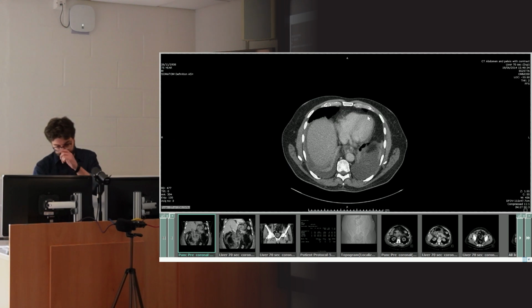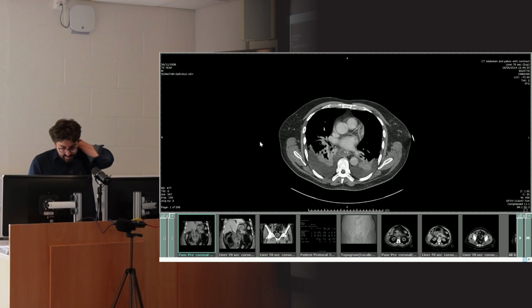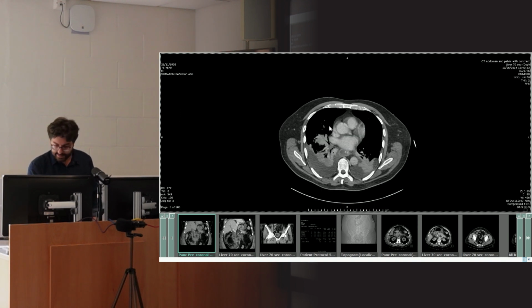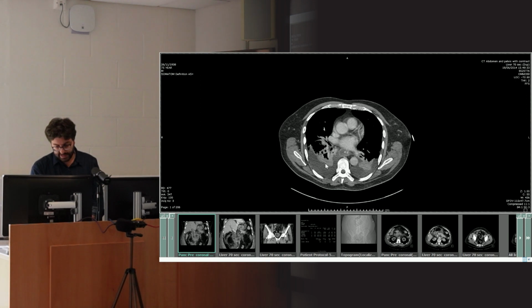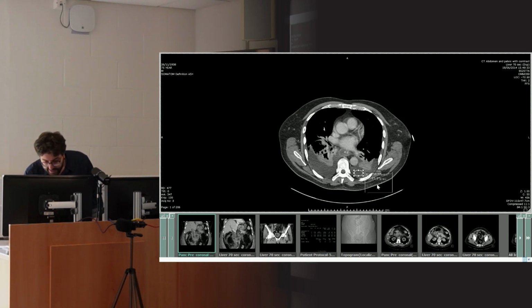This patient, I'll just look at the portal phase for this patient. The first thing you might notice, looking at this patient, is that they don't look very well. Here we are in the lungs. Yeah, see lung windows. You can see beautiful lungs here. But at the back here, we've got a little bit of atelectasis, a little bit of partial collapse of the lung. And then here we've got this stuff, which if I measure it, is around minus 8 Hounsfield units, so close enough to 0.